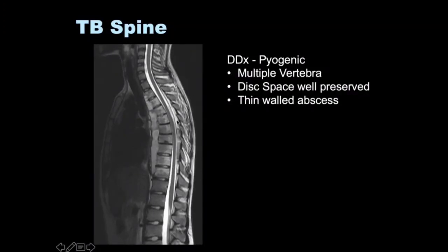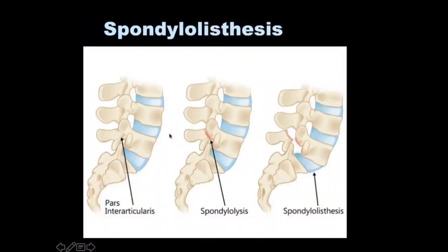For those who've already spotted it, well done. For those who haven't, it's important to look at the spinal canal as well, and there's an epidural abscess on the posterior aspect as well, which is causing compression. Imagine there was a little disc over here, and that would just lead to sort of cord compression in this particular area.